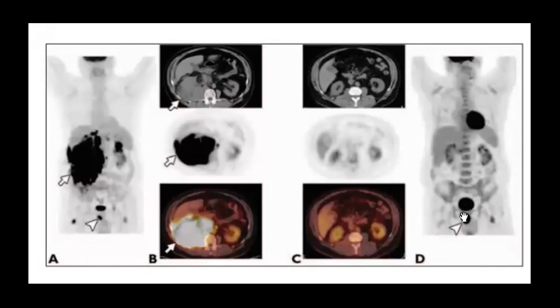And what he wants to show you here, what is this? Can you imagine what it could be? No? It is difficult, but it is something benign. We'll wait 1, 2, 3, 4 seconds. It is inguinal, something like this. It's an inguinal hernia, and it has part of the bladder. That's why it has very high uptake, similar to the bladder. So this is a right inguinal hernia.